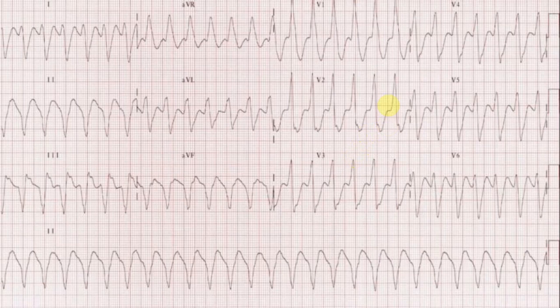This is another bread and butter ECG for any emergency medicine doctor. I found Brugada criteria very useful in interpreting such ECGs. This particular ECG is different from the previous ECG. However, the Brugada criteria is applicable in a similar way in both of them.